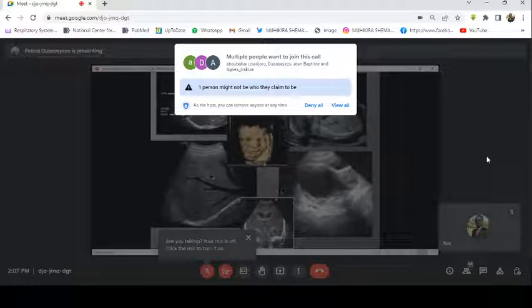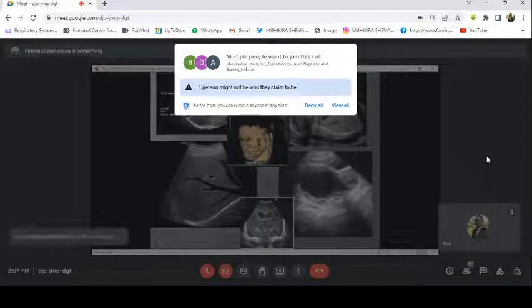Going to this, this is a 3D image of a fetus in the abdomen. Can you see how you can even recognize that the father and the son look the same? Can you see the nose, the eyes, the ears, and even the mouth? It's like this fetus is in the abdomen, in the uterus. This is a 3D ultrasound image.